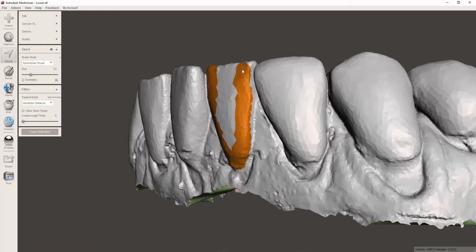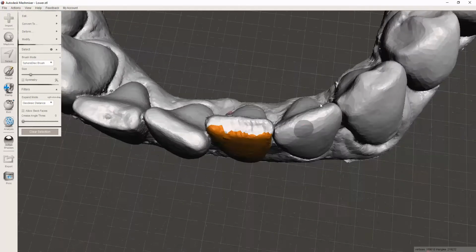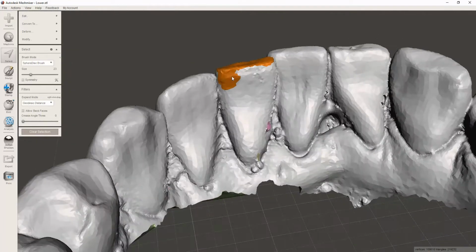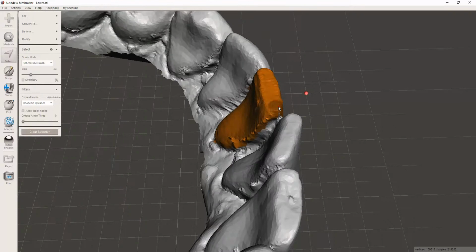Yes, this is a little tedious, but I have done this many times in the lab with wax or composite. I don't suggest using wax, because if you have to suck it down, then all your wax gets smoothed off and the anatomy isn't right. It doesn't work very well, at least not in my hands. But using composite, I guess one, that could be expensive, but we all have little samples of composite that we throw in our lab for that day when we need it. But more so, using composite isn't the most precise way, because you think you're getting the right shape of the tooth, but are you really? Plus, I just prefer sitting at my desk doing it on a computer than doing it that way. And I can always get a new model because I'm going to save it, and I don't have to hope I didn't lose the model or anything.